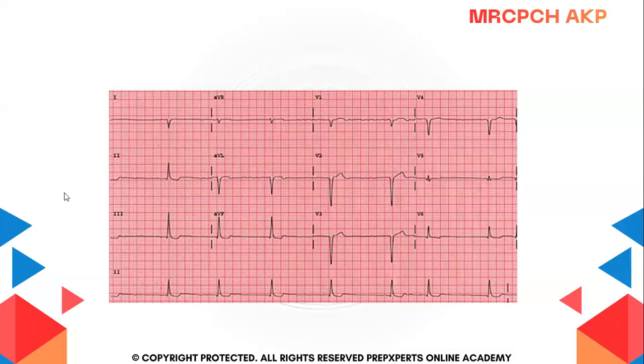So now you know the particulars about the rhythm first, and then the rate, and then the axis. So it's not that difficult. Previously I told you about the normal axis. Normally you are going to get the normal axis, right?